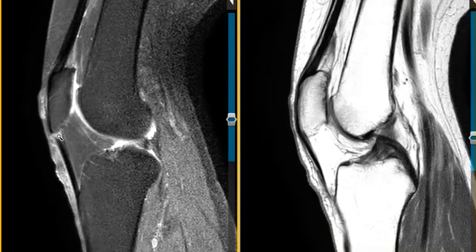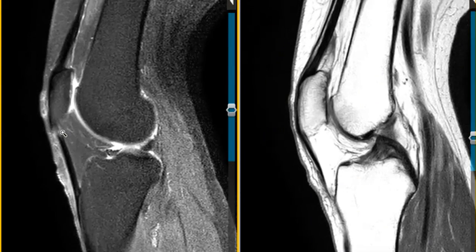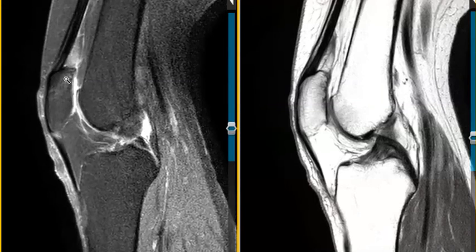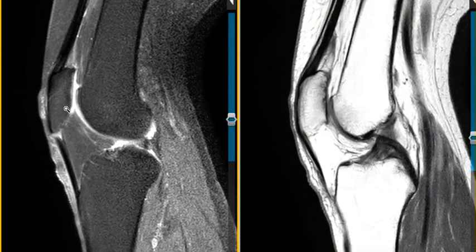In younger people who do jumping or play sports, you can get patellar tendinitis right here. We call it jumper's knee. And in this patient, she doesn't have any sports-related activities, so we just call it patellar tendinitis right here. This is the quadriceps tendon that comes down and attaches along the top, and it looks absolutely pristine. So two findings so far: chondromalacia patella and patellar tendinosis.